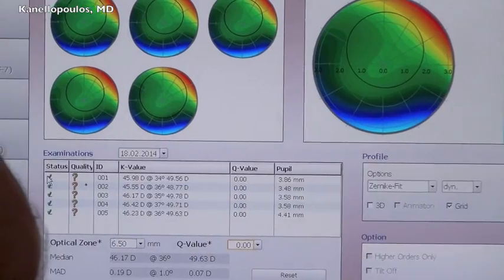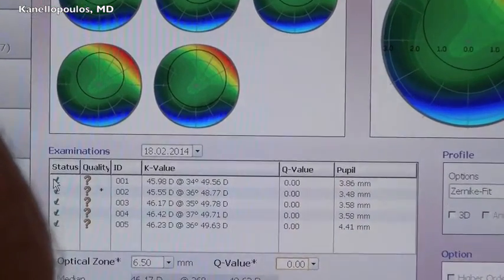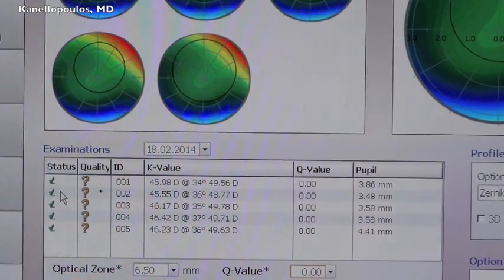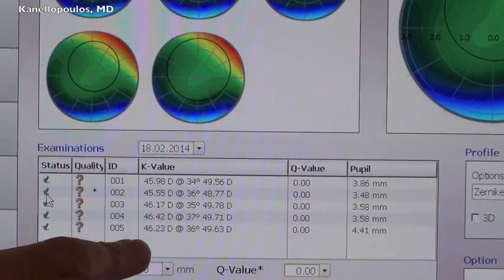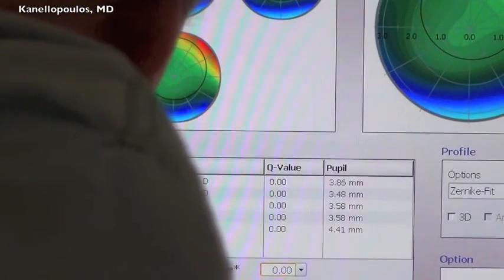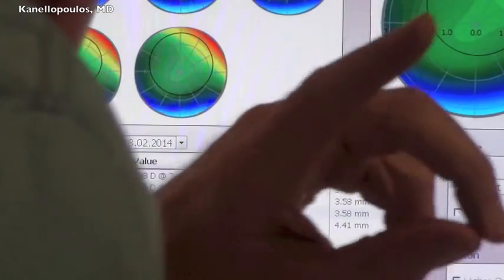We'll have Dr. Waring pick which topography we'll throw out. Number 2 again, okay. And that's because, George? Because the power is... oh no, it's not an outlier. Excuse me, I'm reading that.